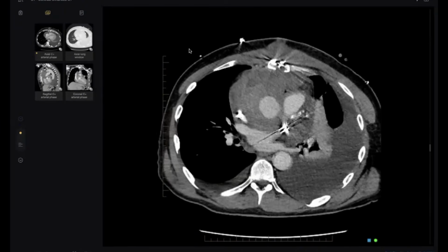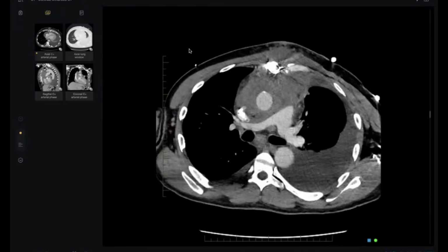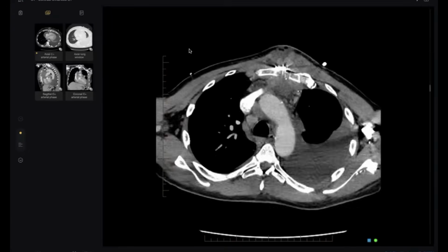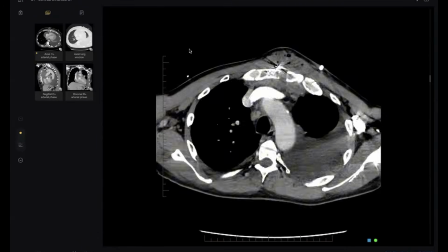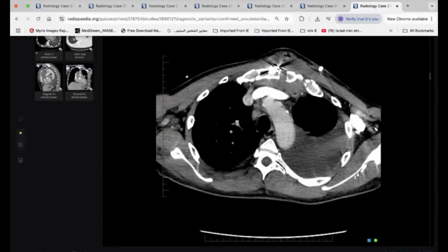There is evidence of recent surgery with dehiscence. There is widening between the sutures, and there is a soft tissue and rim enhancing collection with air locules noted within the surgical site, with extension into the mediastinum.